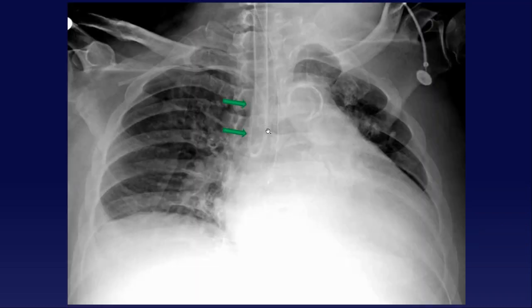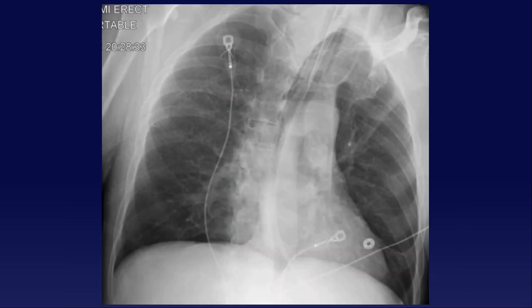But something like this, I have seen some people say, the patient's coding, this is the only vascular access we have, all we're doing is giving saline, and we can't give up this access right now. If they're just giving saline, that's probably okay for the short term, recognizing once the patient's stabilized and they're not coding anymore, they're going to reposition the catheter. So not all abnormally positioned catheters are equally abnormally positioned, but they should all be repositioned at some point, and you definitely should not use arterial or extravascular catheters.